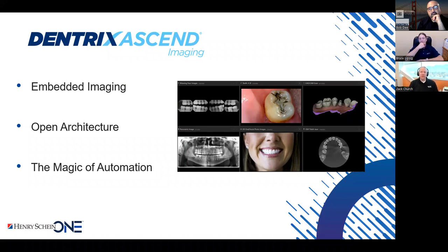We have a real depth of imaging features in our software. And our imaging team has actually been developing digital imaging since before the 90s, if I'm remembering correctly. That's before digital imaging was really a thing. And so that's a depth of experience.